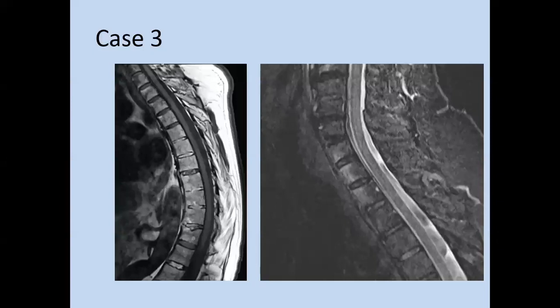We have two pictures of MRI of the mid thoracic vertebra, T1 and T2, showing the shiny corner sign, which is high signal intensity in T1 and T2 at the superior anterior aspect of the vertebra, with squaring of some vertebra and joint space narrowing, and the center of some vertebra at the T1 sequence showing the central high signal at the end vertebra, which is maybe an early sign of Andersson lesion.